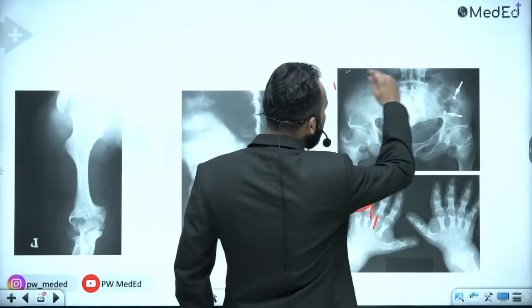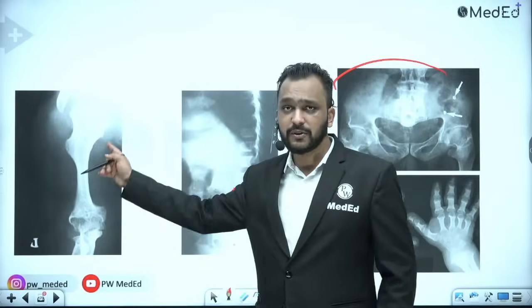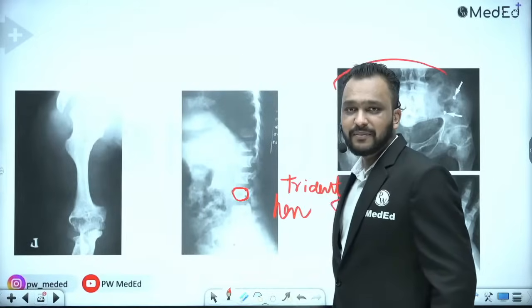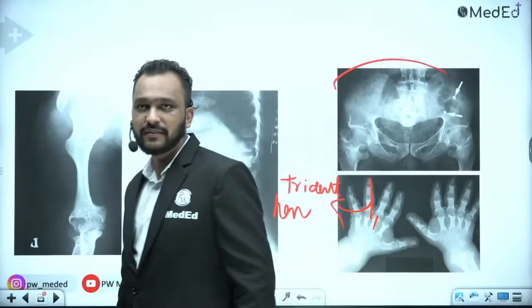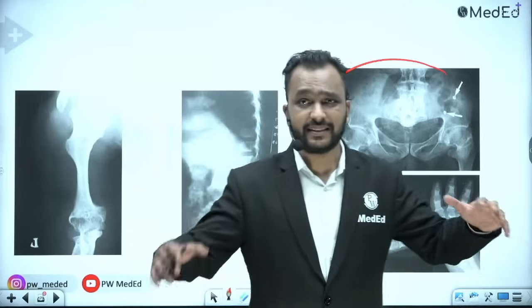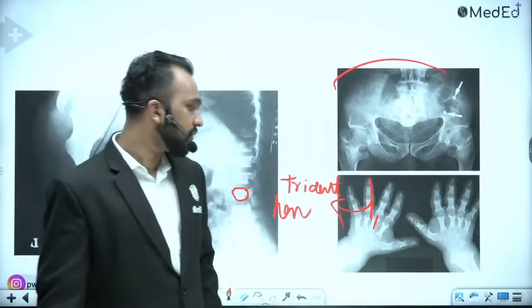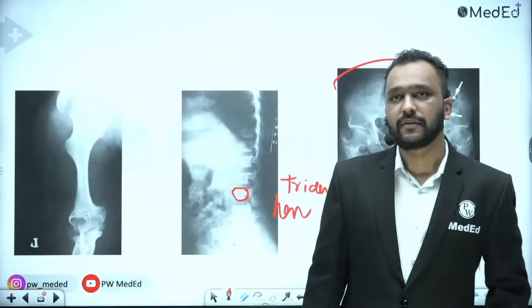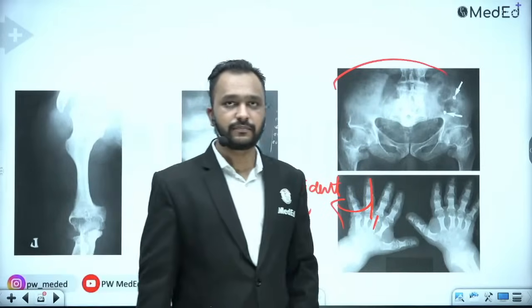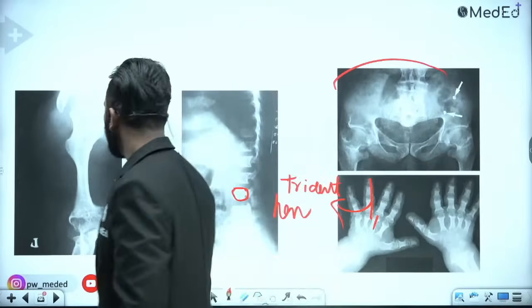And in the fifth image, we can see a champagne glass type of pelvis. So, you will tell me what is the diagnosis in this case. You have to interact with me. So there is rhizomelia, bullet nose shaped vertebra, trident hand appearance, and champagne glass pelvis. So what is your diagnosis for this case? Come on guys, simple question. So this is seen in patients with achondroplasia.